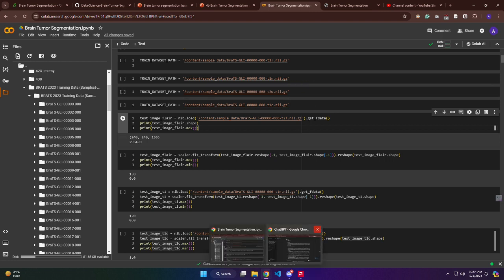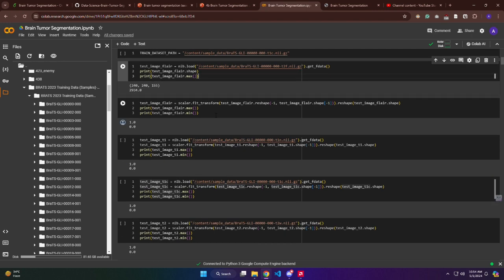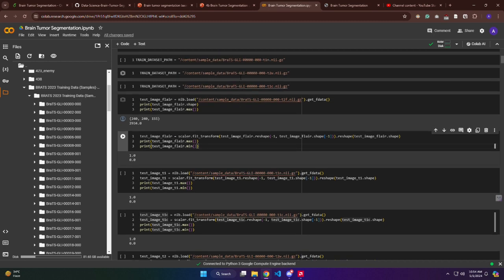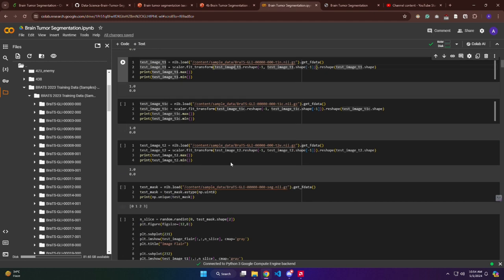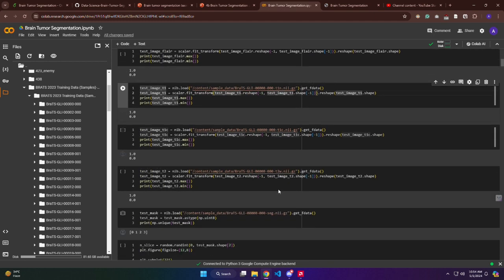In this segment we are working on our dataset and loading a mask, and we also try to segment our brain tumor picture. The mask labels which voxel, or 3D pixel, corresponds to tumor tissue and which does not.